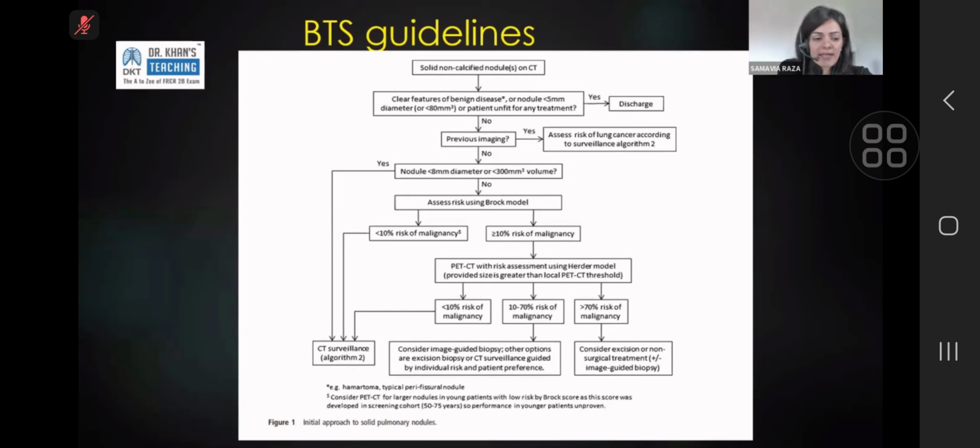So if you do an initial scan and the volume is less than 80 millimeter cube, you can disregard it as benign, or you are allowed to disregard it as benign. If that comes back as cancer in 2 years, you can still look back and say you were following guidelines, so you were absolutely right to do so. There is no absolute certainty that even a 2 millimeter nodule is not cancer. So it's a balance of probability, how we report these.